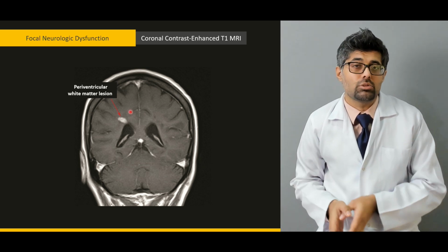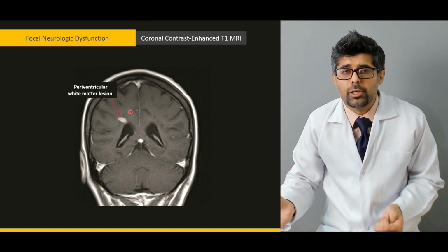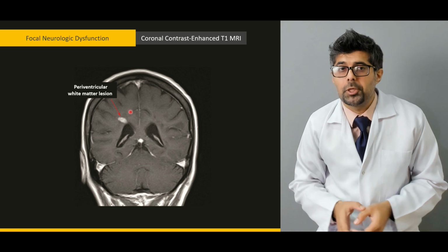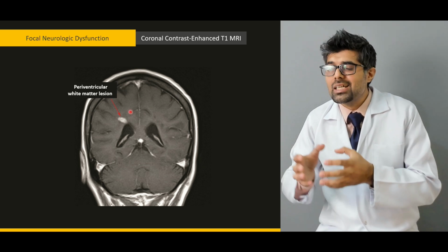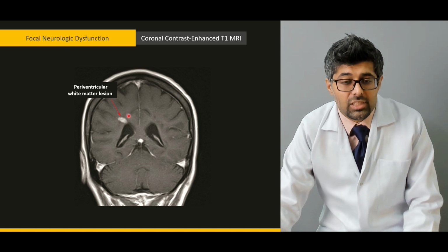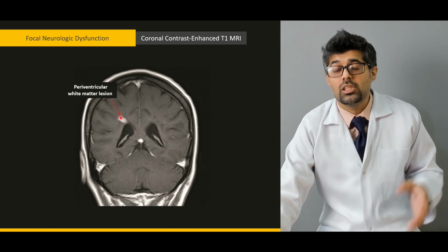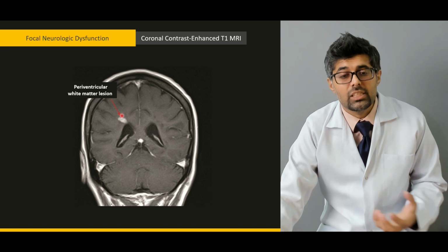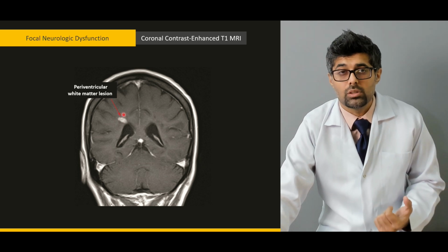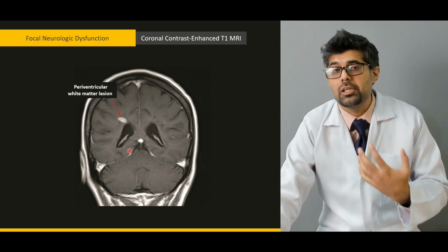You can easily appreciate that these lesions have inflammation, and because of this inflammation, you can easily suspect that this patient has multiple sclerosis. This information is very indicative that this patient has multiple sclerosis. Another point that differentiates multiple sclerosis from other white matter lesions is that this is an iso-intense lesion. As you might recall, the previous lesions were hyperintense. This lesion is iso-intense. It is not as white as those were, so it has almost the same consistency as the other white matter in the brain.